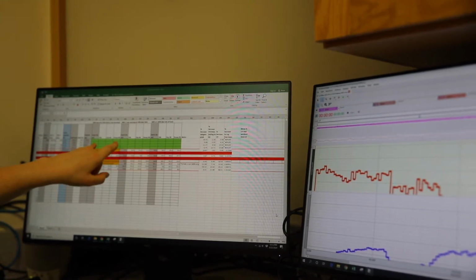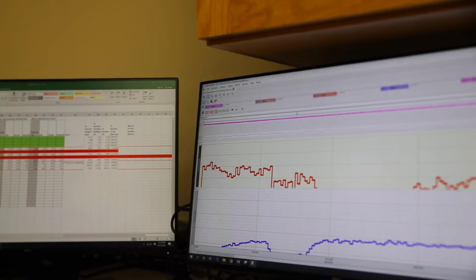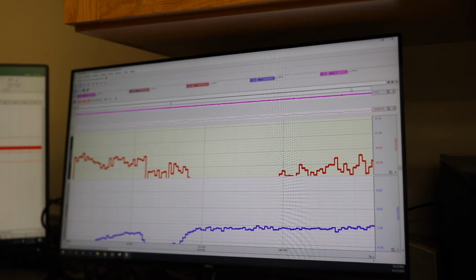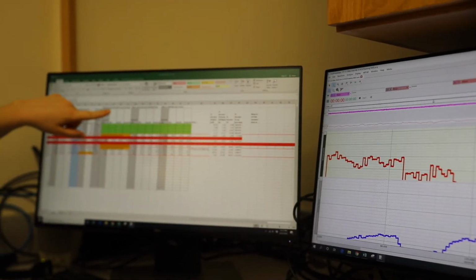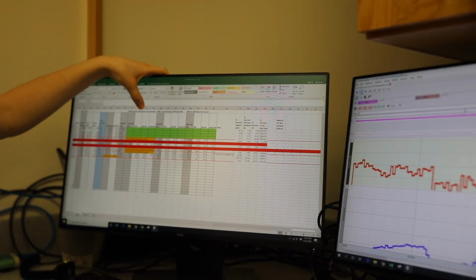So we have those 4 types of data that we want to pull from the NIRS data. This last one over here is just going to show us the time, which will make more sense as I start analyzing.